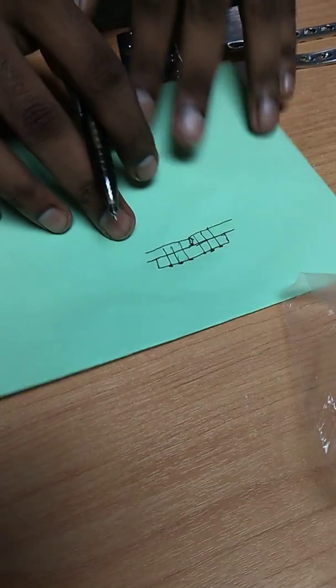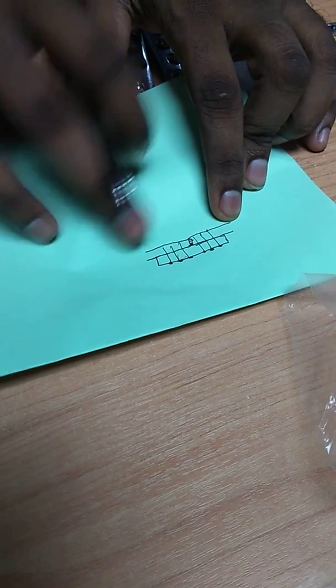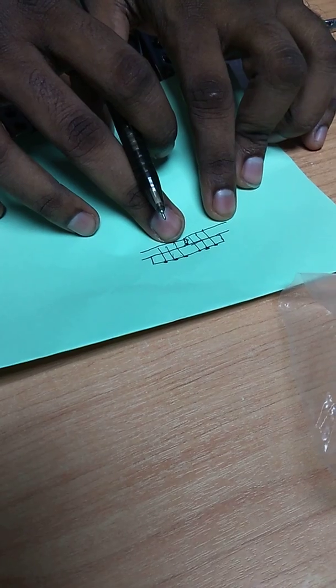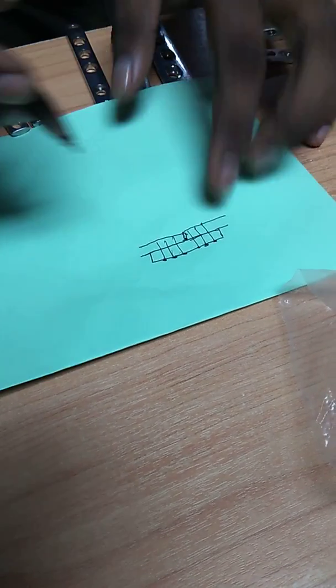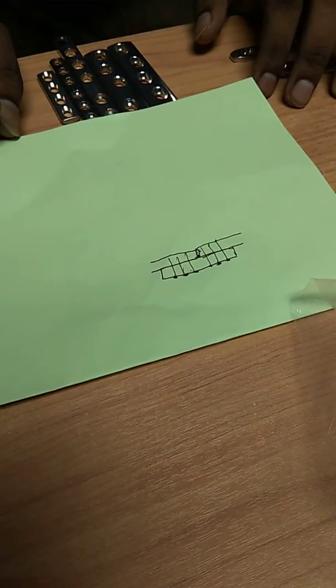Okay, so this is a small bone. For example, it's a radius, probably a mid-shaft radius with a simple fracture. We've already reduced it anatomically, and then another thing about DCP is that it only can fix simple fractures.